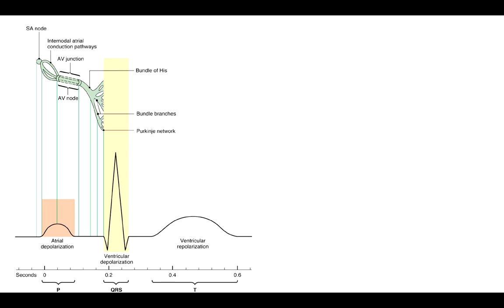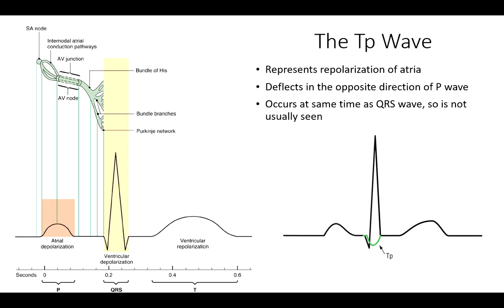We're preparing the cells for a subsequent contraction. They've just contracted, and we're now resetting them, preparing for the next series of contractions. So you'll notice we have atrial depolarization, ventricular depolarization, and ventricular repolarization, but if you said to yourself something is missing, you'd be right. On this figure, you do not see atrial resetting, atrial repolarization. But don't worry, it's still there, you just don't see it.